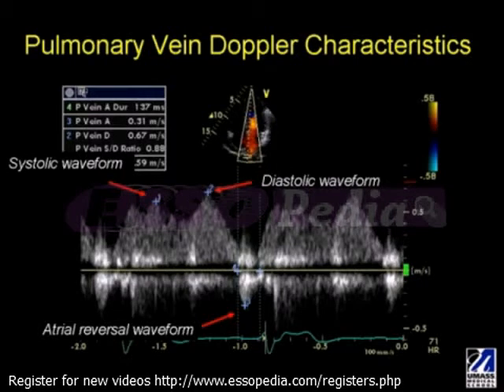Now, the pulmonary venous velocities are influenced by age, and young subjects usually have a prominent D wave velocity. What this reflects is a tall mitral E wave, both of which are a product of diastolic suction, not elevated left atrial pressure.